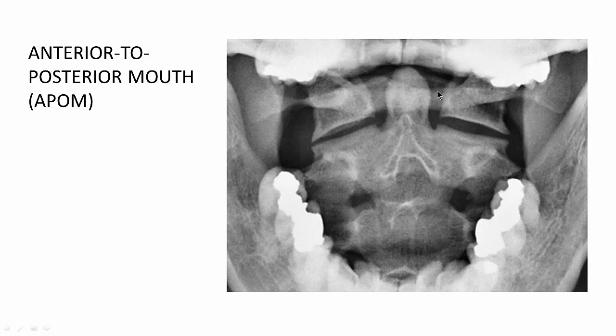This is the posterior arch coming around. See, it goes right through the odontoid here, so make sure you don't think that's a fracture. See, there's a density change here. It's actually the posterior arch going around. The anterior arch is superimposed, smashed in there as well.